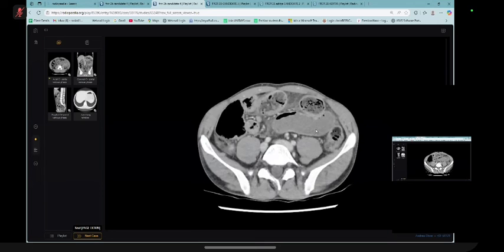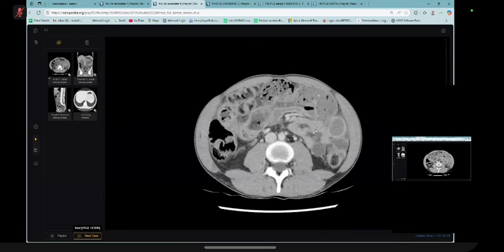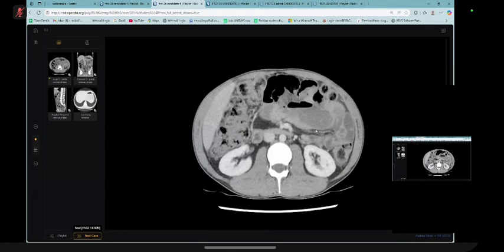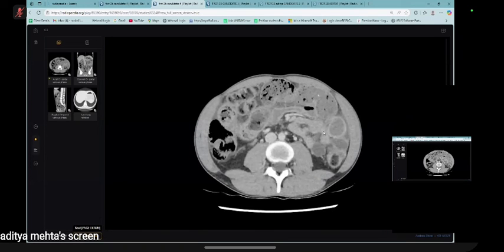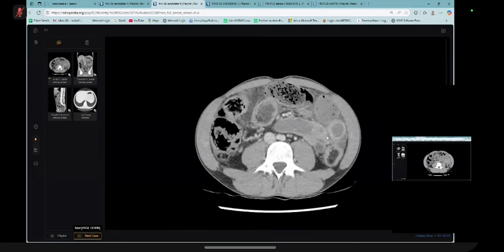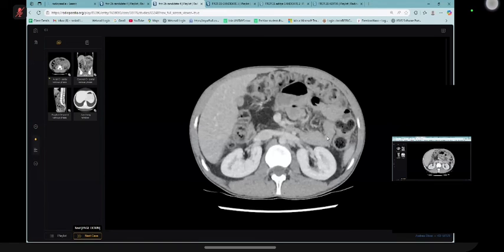You have to give your entire opinion, whether there is obstruction or not. I'm a clinician. You can't expect me to be a radiologist who understands wall thickening and such. You tell me your opinion. What do you think? The final opinion. Yes, sir. It appears to be a closed loop obstruction, more localized in the jejunal loops.